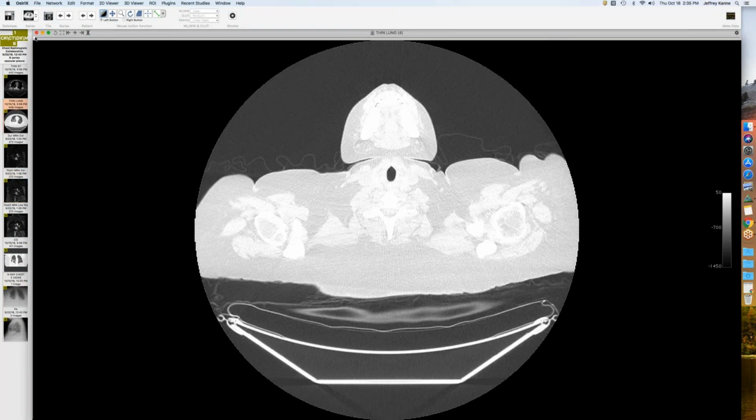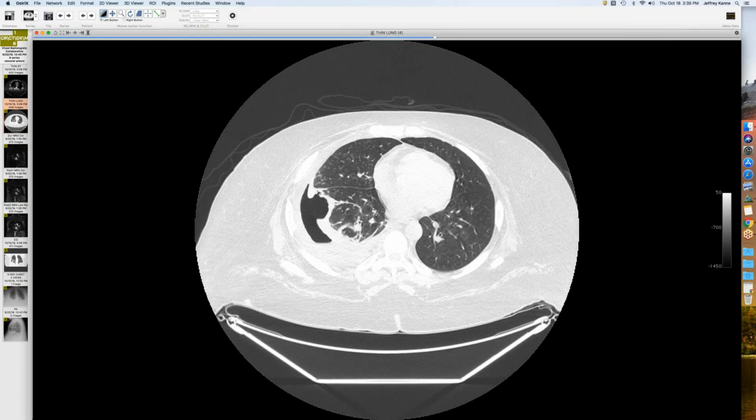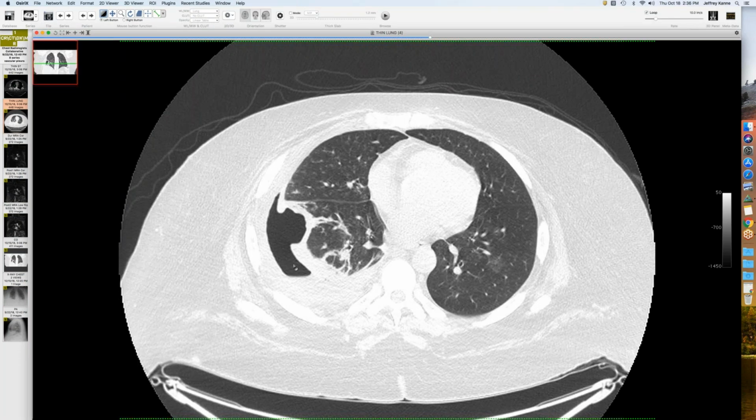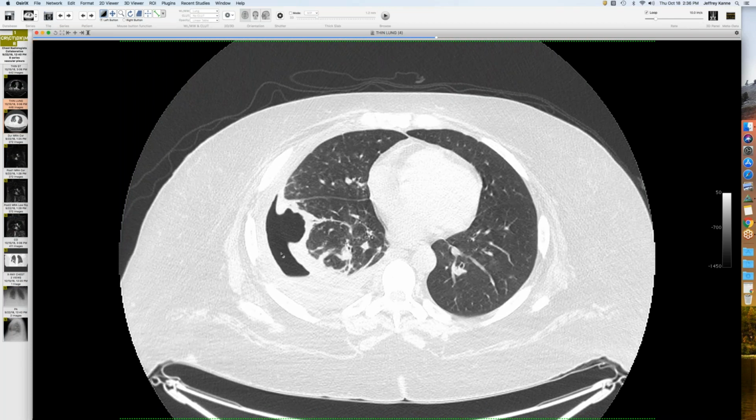They did a CT because of the concern about what was going on, and you can see the area right there has now cavitated and ruptured into the pleural space, and there's a nice little bronchopleural fistula going right into the pleural space. So it's really a broncho-infarcto-pleural fistula. But I've never seen an infarct disrupt the pleura. So I wonder if this got super infected.